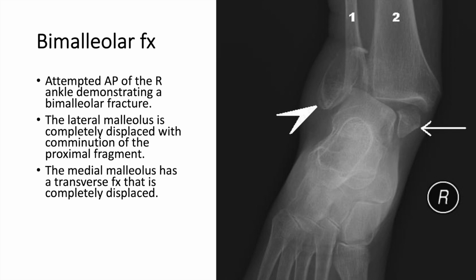All right, and then when you're doing ankle reads, you always want to make a comment about the talus. All right, so we can say here that the talus is also displaced laterally with significant tilt. All right, so this is sort of how you do your ankle reads. As a student, you will see a ton of ankle fractures. So the sooner you can get better at these, the better it'll be for you. So again, take your time, go with each mal, and just try your best. All right.